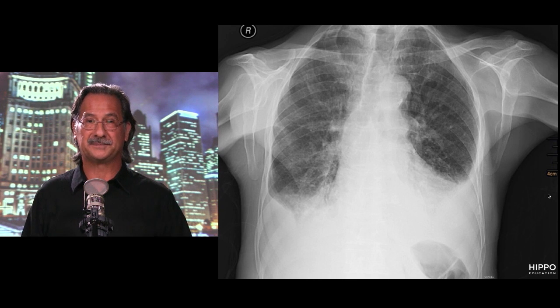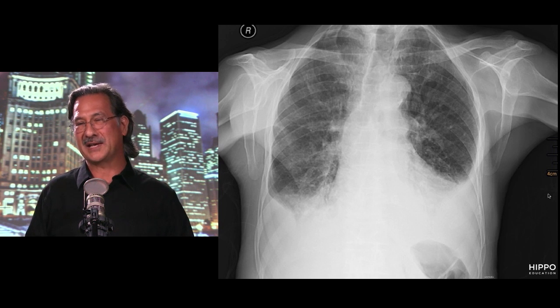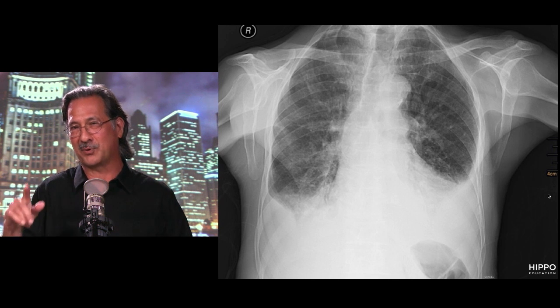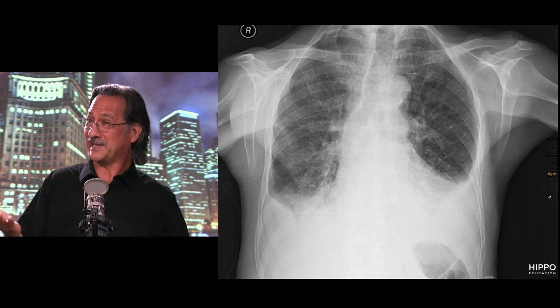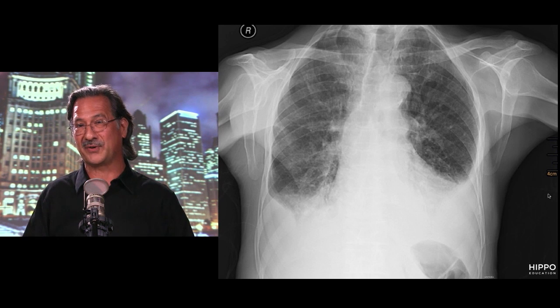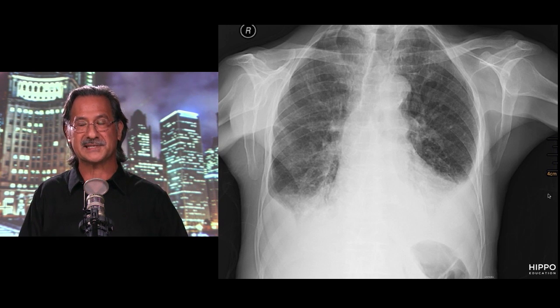So the other thing that might be important to keep in mind is how much volume is there. As a general rule, on the PA view in adults, when we see blunting, just that filling up of the apex portion of that clear space inferiorly of the lungs, it takes about 250, 300 cc's of fluid to cause that blunting. Almost a can of soda. Right, exactly, just about that volume. On the lateral view, it takes a lot less because we can see the costophrenic angle a lot more clearly on that one. So that takes about 75 cc's of fluid to distinguish that.